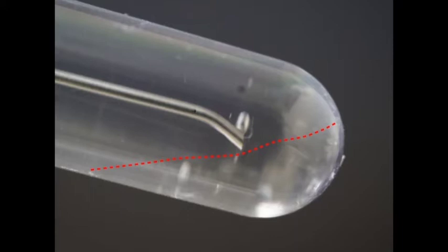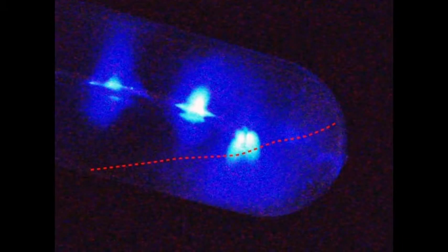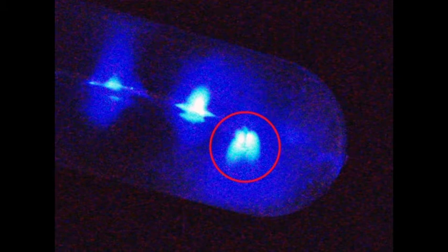We oscillated a Kelman tip in torsional mode. You can see luminol chemiluminescence inside the Viscoat shell. We think this indicates interaction between the viscoelastic material and the cavitations.